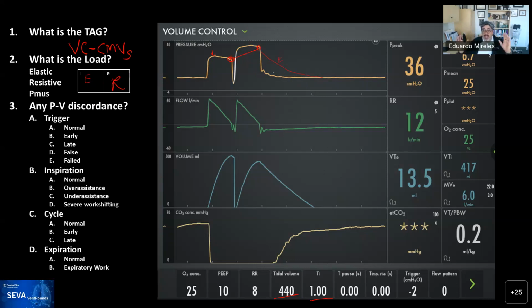So now that you know that, your brain is starting to think, well, could this be dynamic airway collapse? I see that from Siram. And that's the way that you should be thinking. Something is increasing the resistance massively during expiration. We'll come back to what is causing this in 2 seconds, but we dropped the respiratory rate for this patient. I'm going to show you what was happening to the patient hemodynamically in a couple of seconds, but I want to highlight one of the items that this can trigger, which is what happened over here.